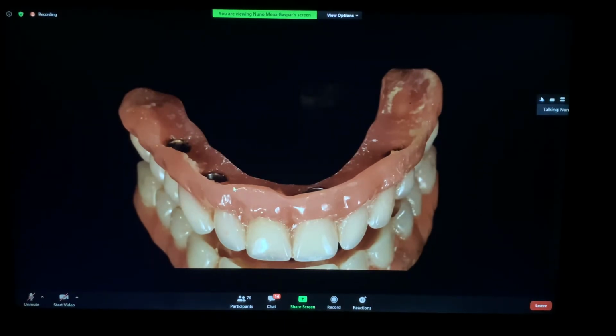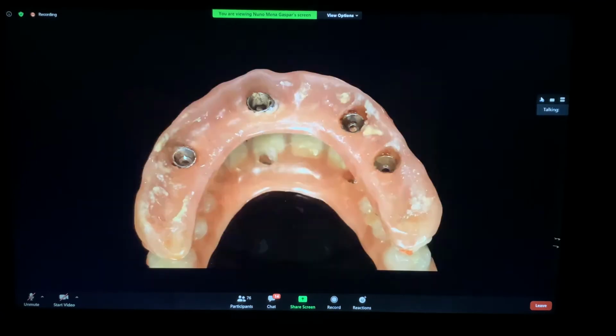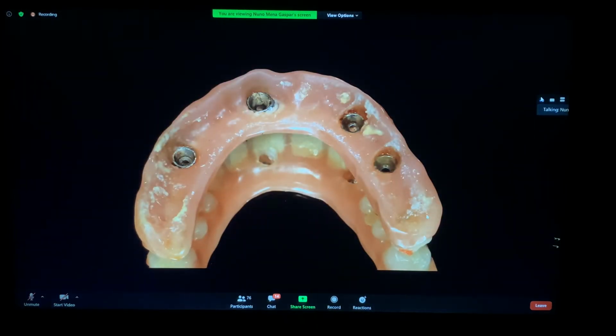This is not the way to do a full large prosthesis, because this flange will never enable the patient to clean this. Và vì do là phục hình không có đủ khoảng và do không mài chỉnh xương. So it's like this. Bệnh nhân không có thể vệ sinh tốt được.